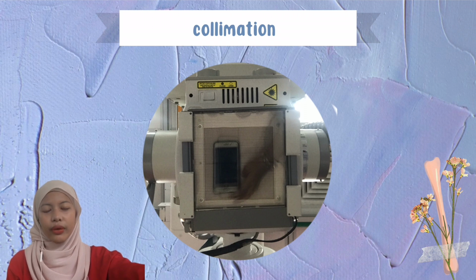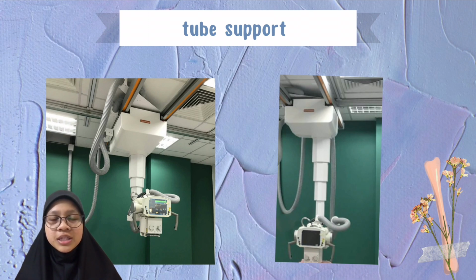Collimation will help the radiographer to target the area of interest in order to minimize the exposed area as much as possible. Tube support consists of two perpendicular sets of ceiling-mounted rails, and this allows for both longitudinal and transverse travel of the X-ray tube. This will also allow for adjustment of SID, which is source to image distance.